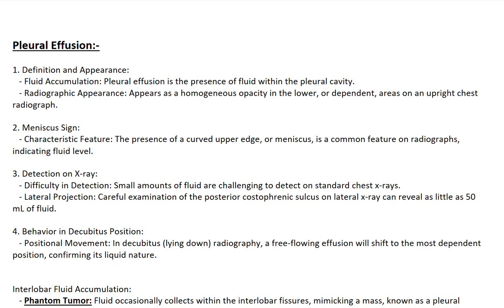2. Meniscus sign. Characteristic feature. The presence of a curved upper edge, or meniscus, is a common feature on radiographs, indicating fluid level. 3. Detection on X-ray. Difficulty in detection. Small amounts of fluid are challenging to detect on standard chest X-rays.